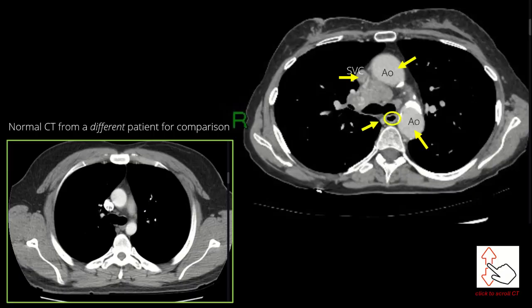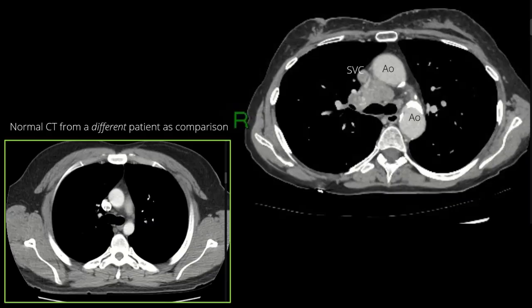What about these two? The arrow is pointing to the azygous vein, and the circle is indicating the esophagus that is open with air at this moment. It can also be seen in the reference image as a solid circle. The merged two dark circles just anterior to that is the carina, where the right and left main bronchi are starting to branch off. So now we know some of the normal anatomy.